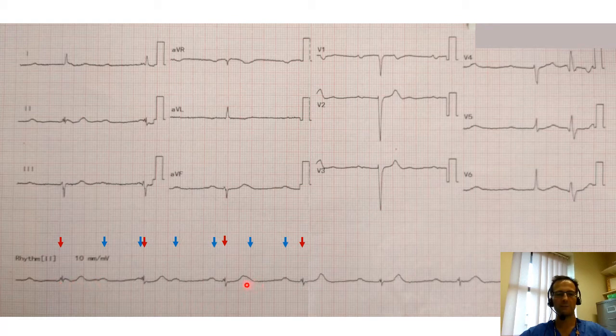Over here, this T wave has got a P wave on its back, and so it's broader than the T wave when it's in isolation. And here this T wave has got a P wave standing on its head. So you can see that the P waves, even when they're merging with the ventricular signal, you can map them out like this. And so you can very clearly see this is complete heart block.